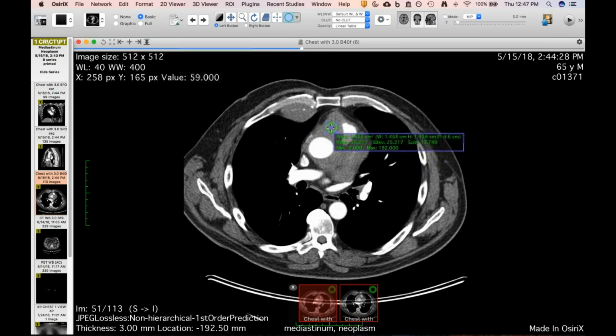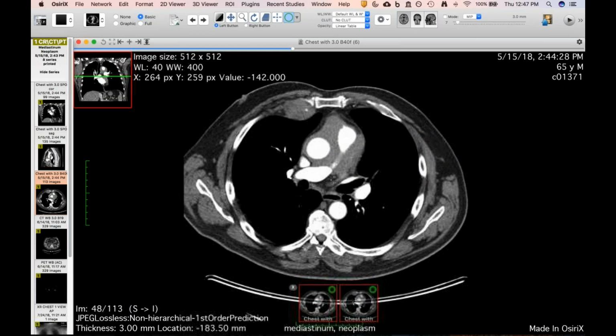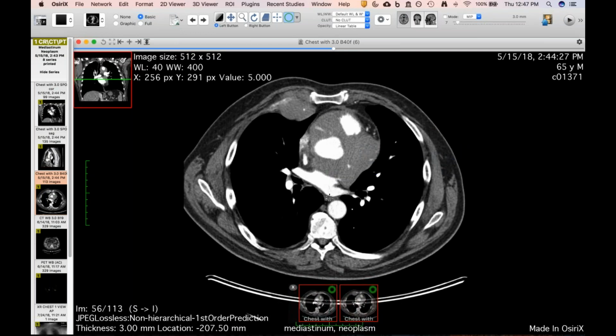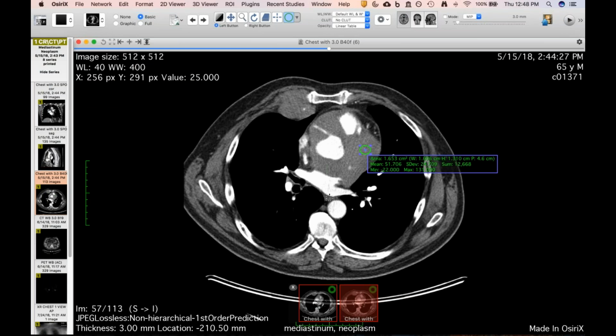Yeah. Well, there was a case that we had with a CT scan 2 days ago that had a similar looking chest wall lesion to this, but it was a little more spherical, and the attenuation in it was 27, and there was one little piece of calcium in it. And I was thinking it looked more like a myxoid sarcoma or something like that. Not a chondrosarcoma with a lowish attenuation.